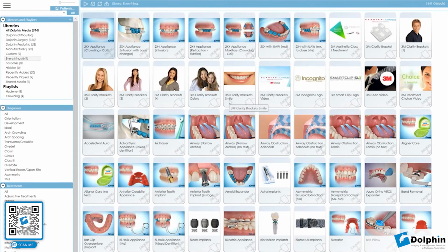So what we did today was kind of do a nice little overview of what Aquarium has to offer. Oh, also, we want to show one more thing here. Now, a lot of our users might have suggestions on what else we can add to Aquarium that maybe we do not have in our library.